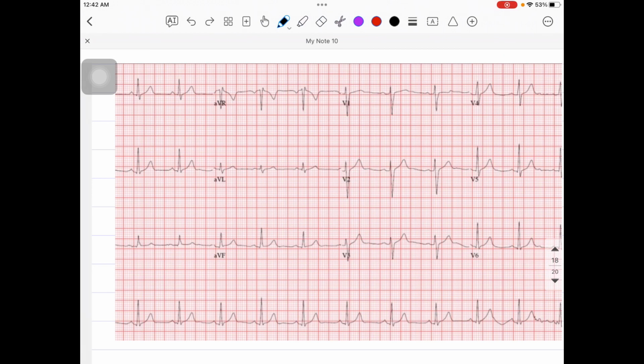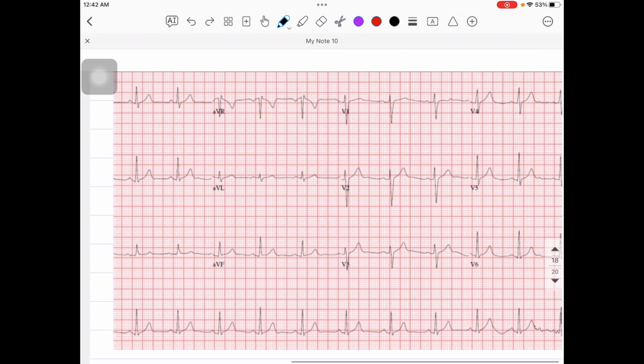But in this session, what I want to discuss is, look at this one, guys, the chest leads. So what are the left sided chest leads and what are the right sided chest leads? If you place the chest leads onto the chest of the patient, you begin from the right side and then go toward the left side. So if you are placing the V1 lead, which side are you more toward, left or right? You are more toward the right side.